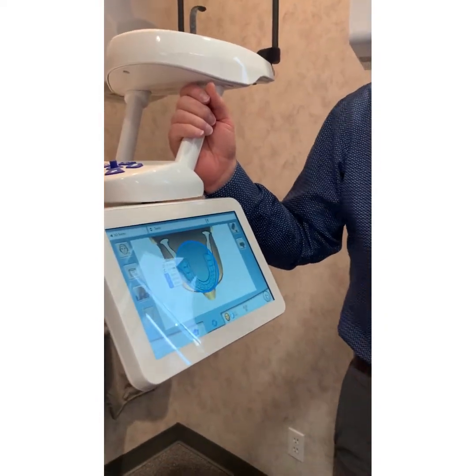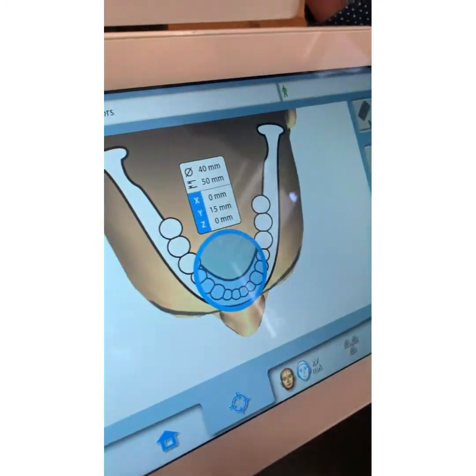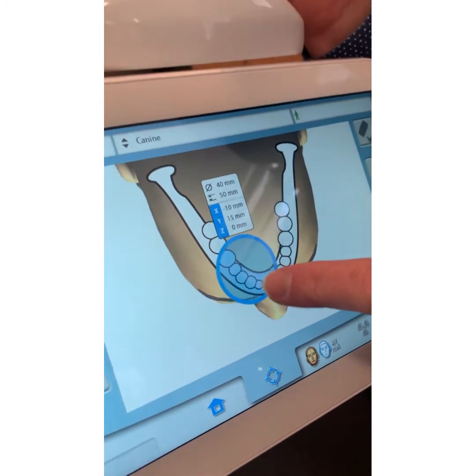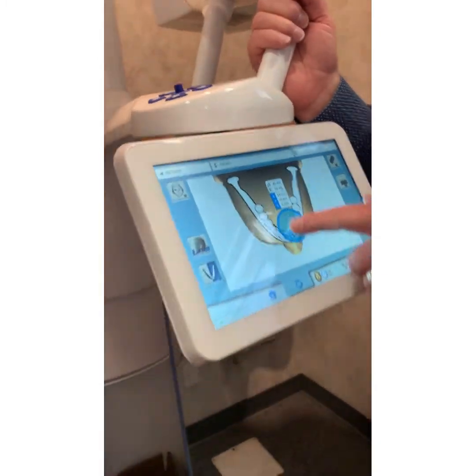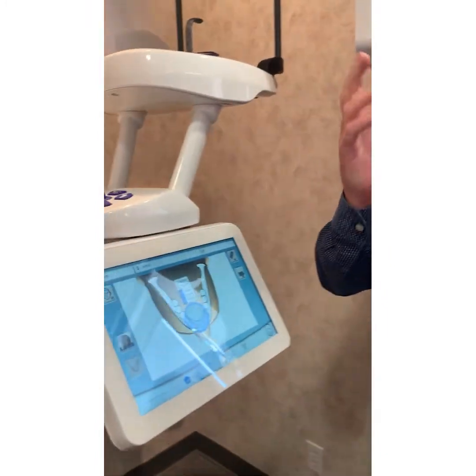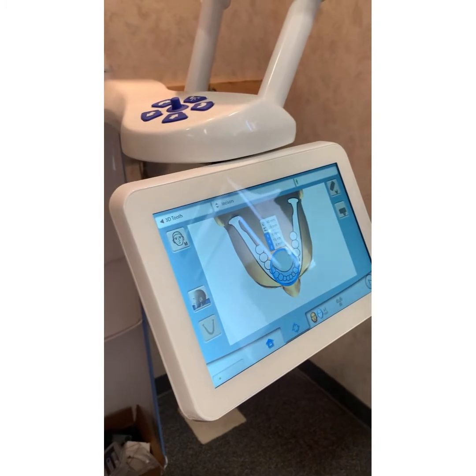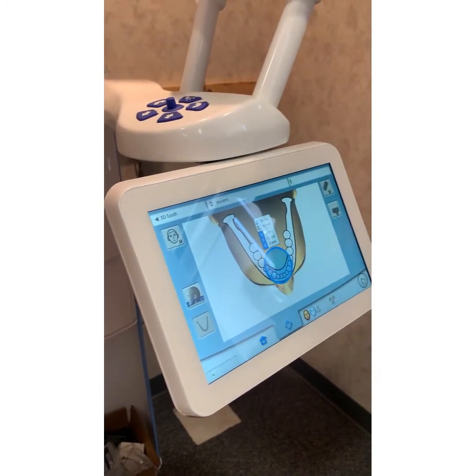Less exposure. When we do a follow-up training, we'll talk a little bit about this. Here's your endo tooth. See how small that is? That would be endo, if you just wanted a root canal shot. And this is your tooth at 5 by 4. That's kind of another session, but we'll discuss how to position that right so that you're not taking a scout like, oh, I missed it, and then come back, position, oh, I missed it again.